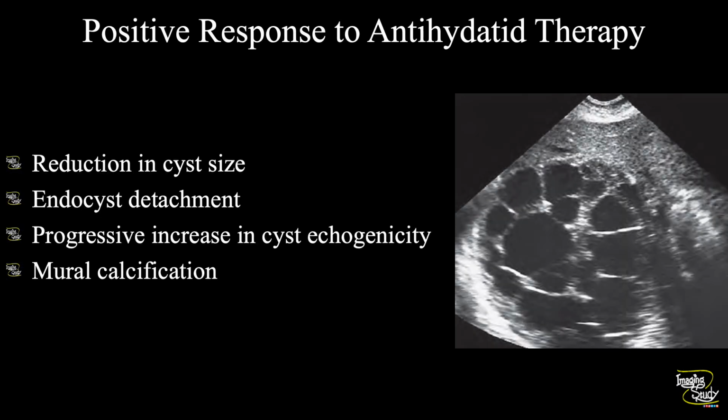If you give the patient anti-hydatid therapy, then there will be reduction in size, the endocyst will be detached, and the echogenicity of the cyst will progressively increase. You may also see some mural calcifications.